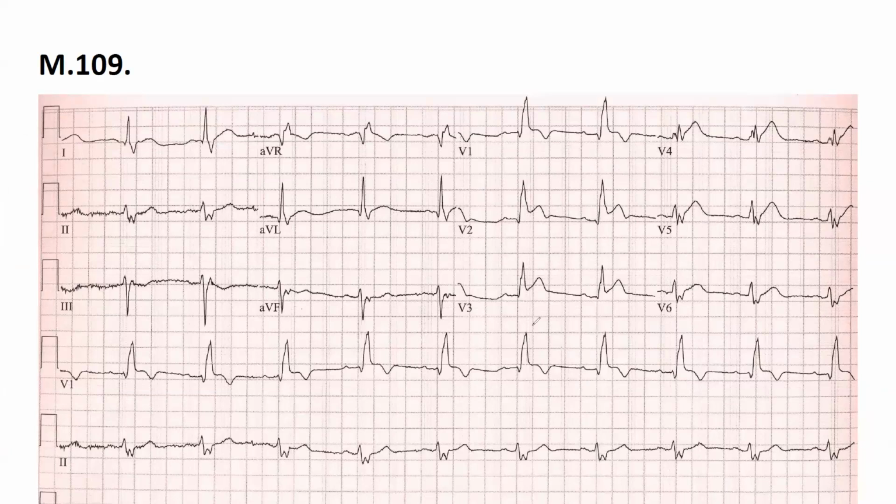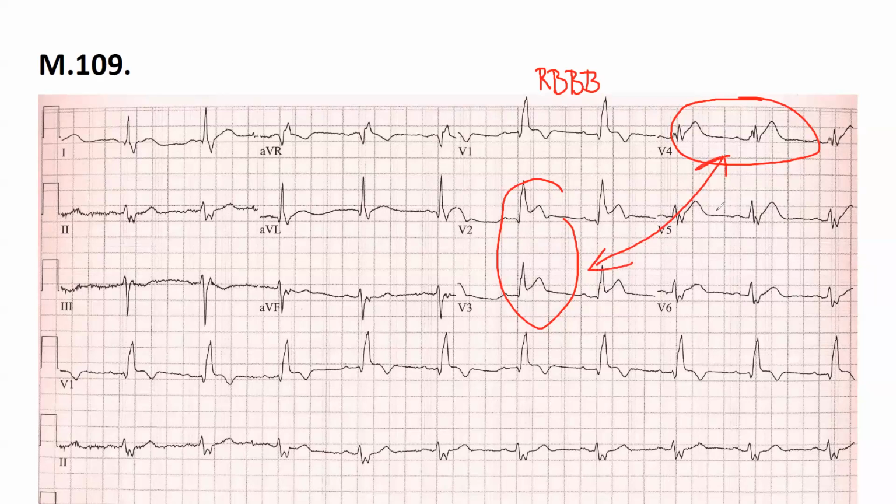Right ventricular hypertrophy or anything goes with a big R and deep S, but we said that's a RBBB, the right bundle branch block we had. That's okay. And because we have ST elevation in V2, V3, V4, we have an anterior STEMI. This is STEMI.